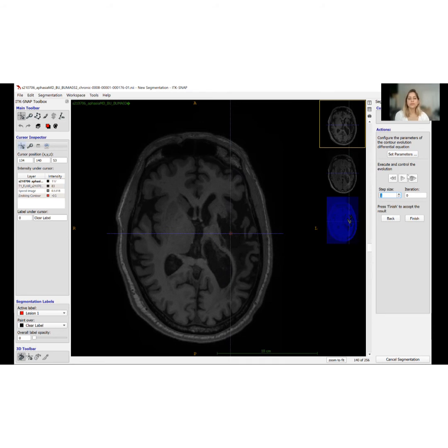Okay, so I'll just go ahead and run this, and we'll see how it goes. Do you set any other parameters at this stage? So you can, and we'll see how this runs, and then we'll look and see if we can adjust some other parameters. Is it still growing?